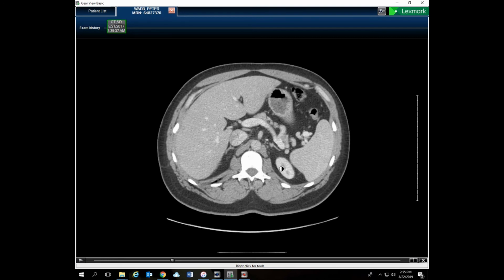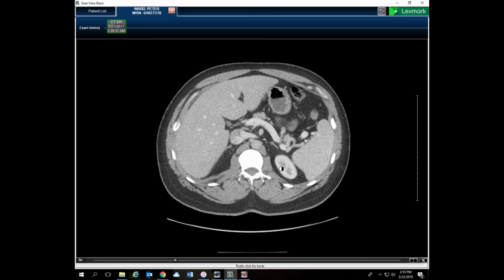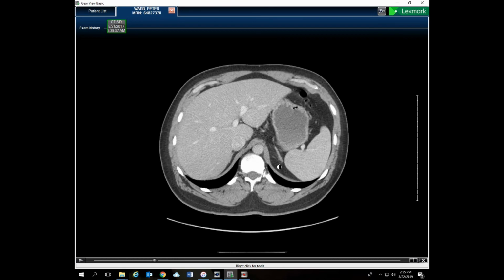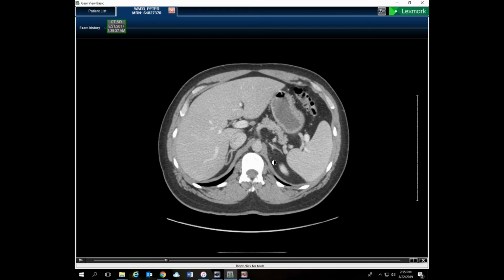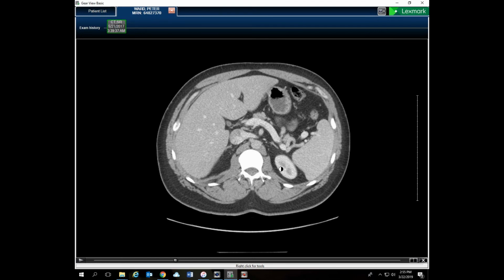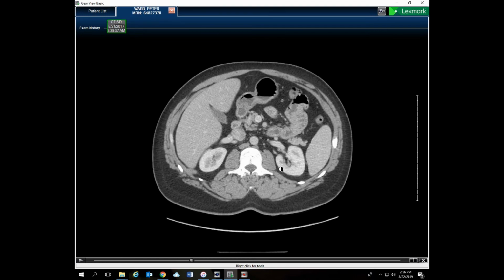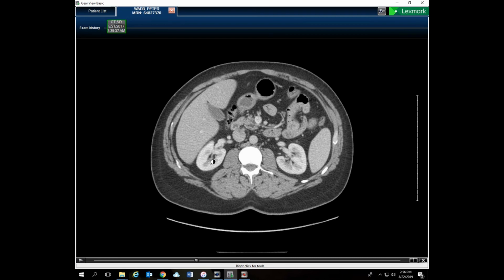So here, one thing I want to actually note is the adrenal glands are not super visible, but they're going to be hanging out just superior to the kidney. So right here, and then we get our kidneys coming into play. And the renal cortex, the outer layer, is a bit brighter. The inner area is the medulla, it's a bit darker, and the very dark area is the urinary space where there's actual urine being released.